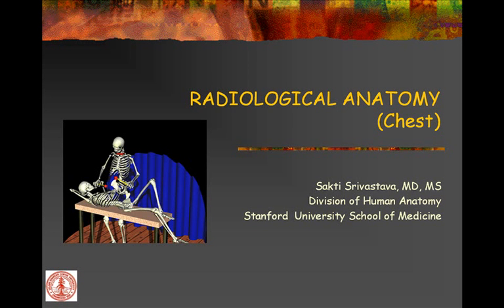Welcome to this module on radiological anatomy of the chest or thorax region. In this module, we will look at several normal and abnormal clinical images related to the chest or thorax region and make an attempt to correlate anatomy and radiology.